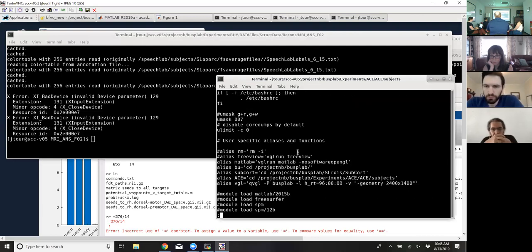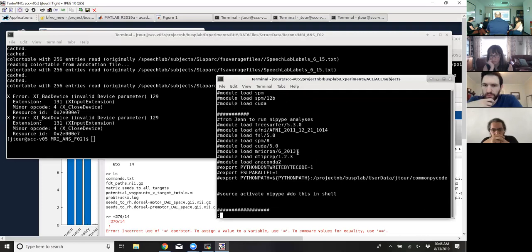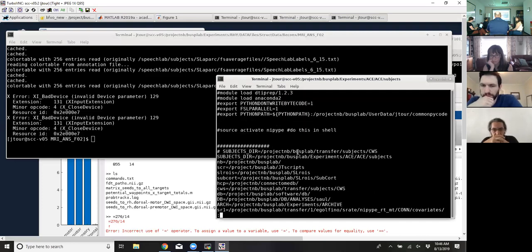So if you haven't played with an RC file, the one that is addressed when you open a terminal, by default, I think on our system, it's bash terminals. So if you haven't played with that, it's worth doing. And if you have played with it, these things that are in here, it's doing something on the command line. You can set these on the fly.